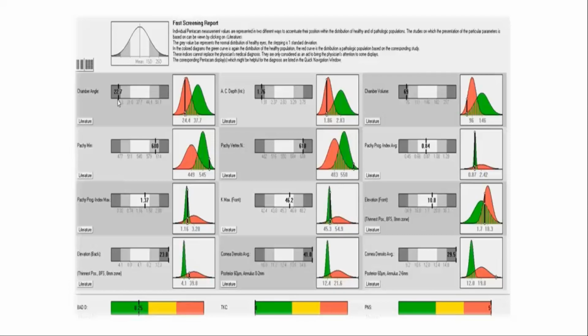Now, the only thing is that this map may be a little fallacious because, for example, for pachymetry, it is assuming that a very thick pachy is green, which is not necessarily right, isn't it? I mean, it's labeling it as green because it would appear in this green part of the map, right? Because even in the green part, 600 is actually appearing in that. Yes, sir. I'm just thinking that in the green part also it is actually showing the extremes of the curve.